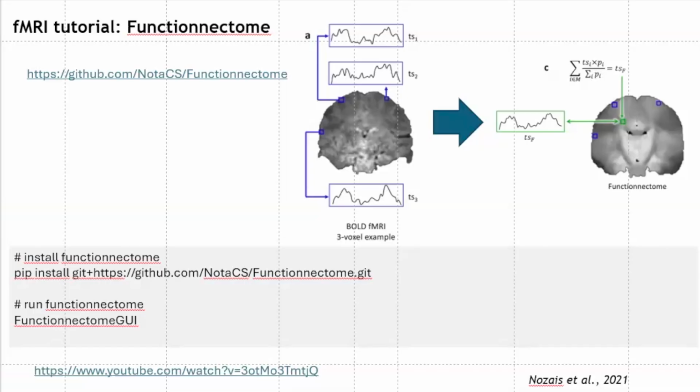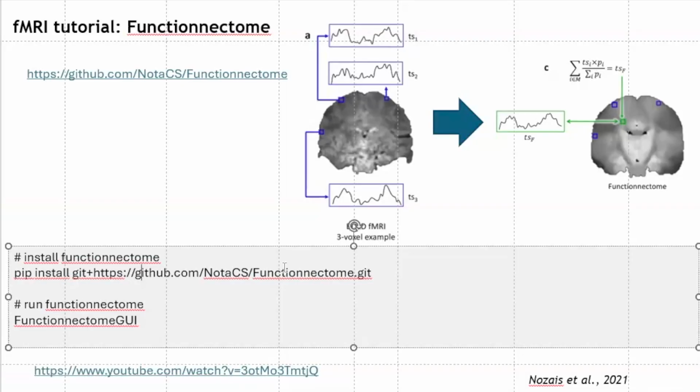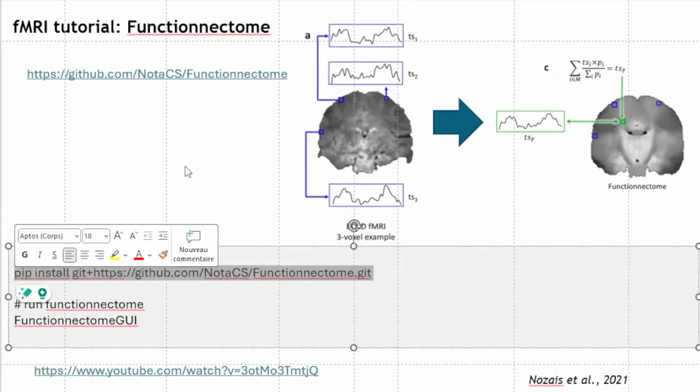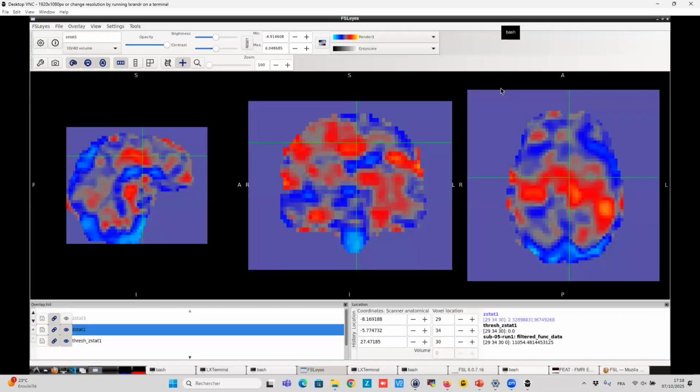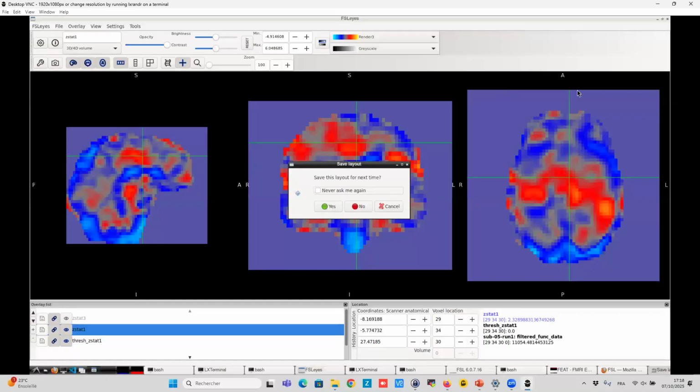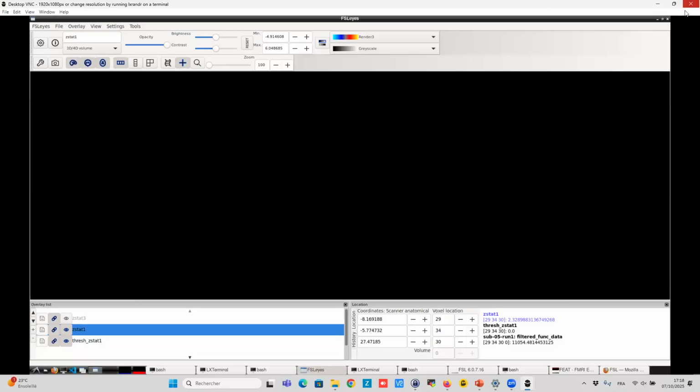We shall already make the explanation of it, but there is a command line we will use here. It's on the GitHub again. So if we go there, let's take the first command. You do that, so yes. Okay, so let's close everything. Let's get rid of everything.